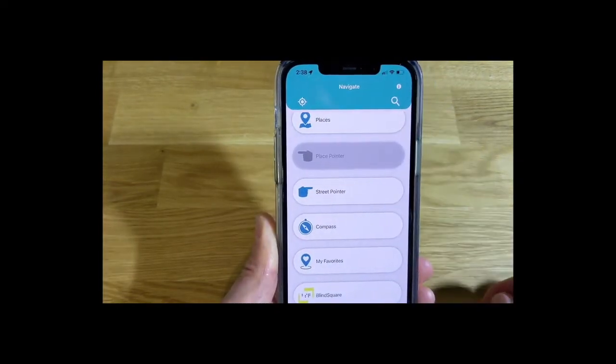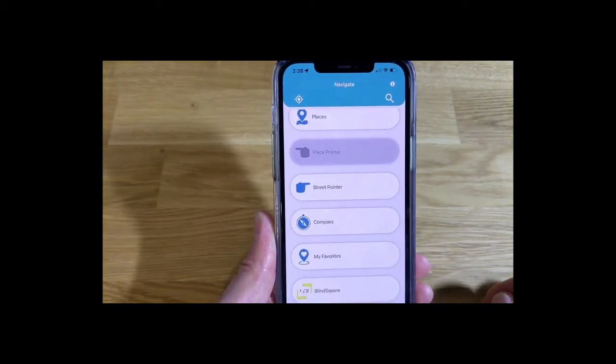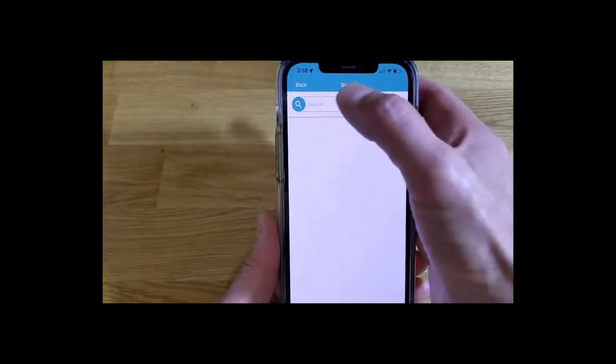If we choose that location. Getting your location, 201 West Valley Spring Road. The nearest intersection is Valley Spring Road. And we also have a search icon if we would like to make a search to find things nearby.